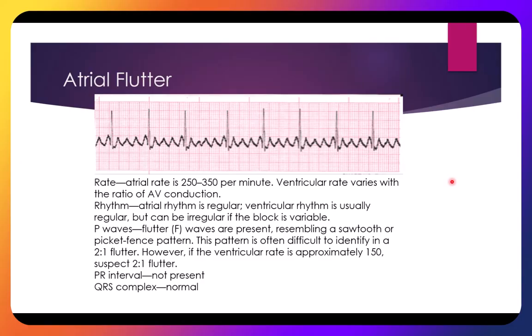One of the good things about the way the heart is designed is that it filters out most of those impulses to keep them from coming through. Now, this needs to be treated, and most of the time it's going to be treated by the cardiologist. So as we're going through here, we have both an atrial rate and a ventricular rate. I think we said the ventricular rate was 1, 2, 3, 4, 5, 6, 7, 8, 80.